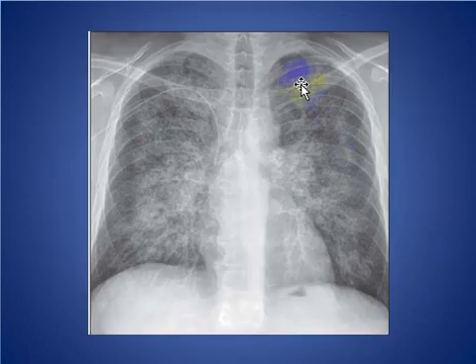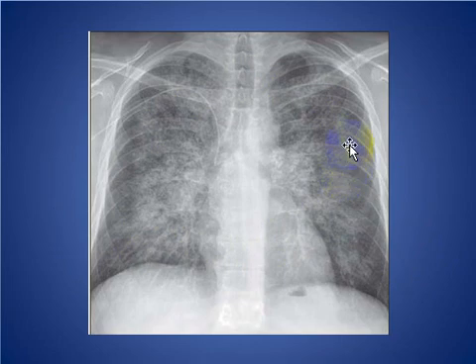Here in the chest X-ray, you see bilateral airspace shadowing involving both lungs. Here we see the central distribution, and the airspace shadowing is sparing the lung periphery. And this is the classic appearance of bat wing appearance due to left-sided congestive heart failure.